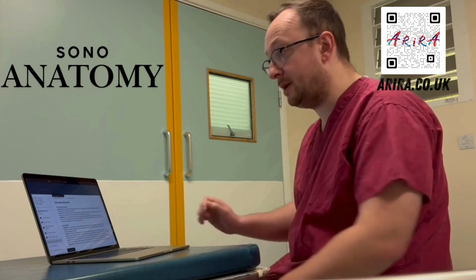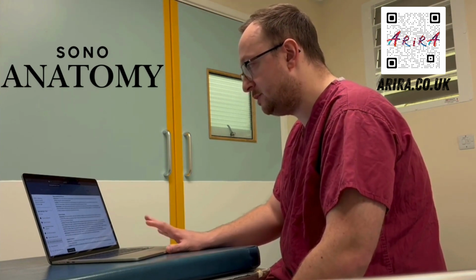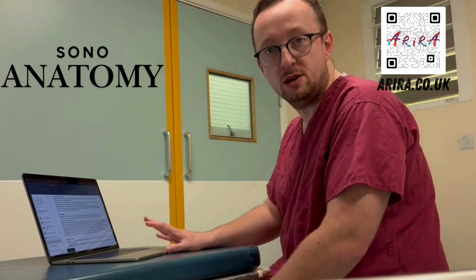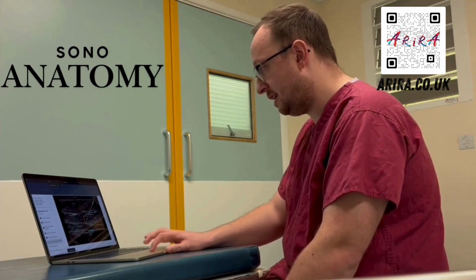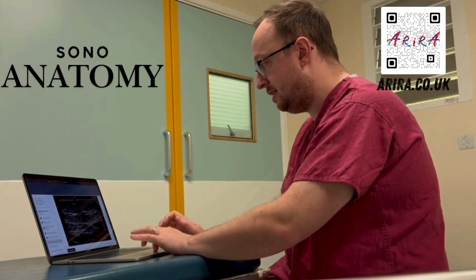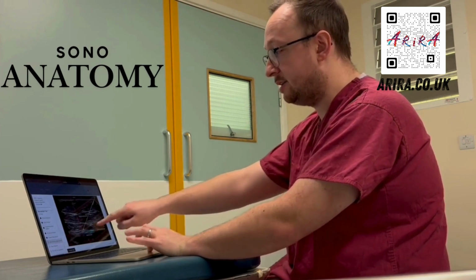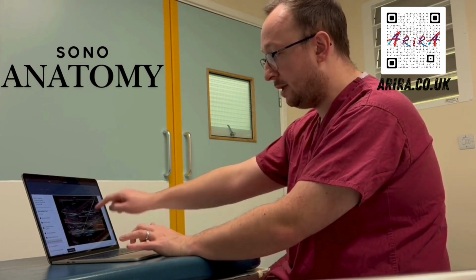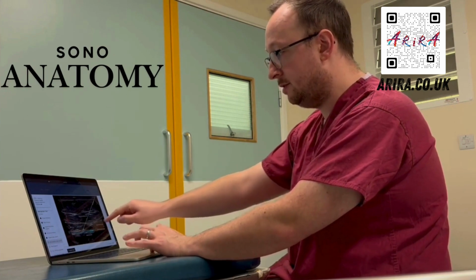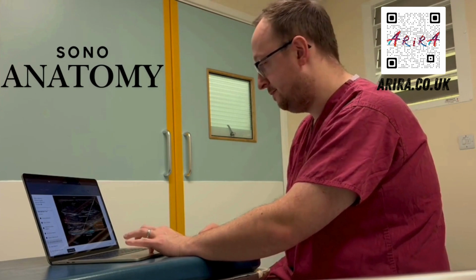And this is the sono-anatomy glide view, which I actually quite like as well. It gives you a bit of a description about what it should look like. And as you can see here, you've got an ultrasound image on the left, there's no labels, so you can drag that away. And as you move the cursor over, you can see that it again highlights the relevant structures, the way that the needle should aim for, which is really helpful actually.